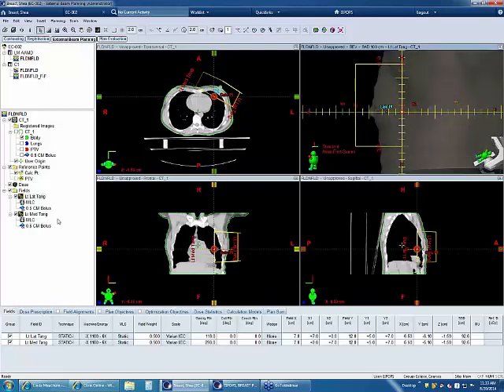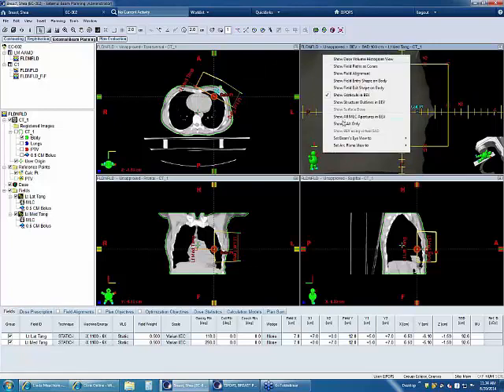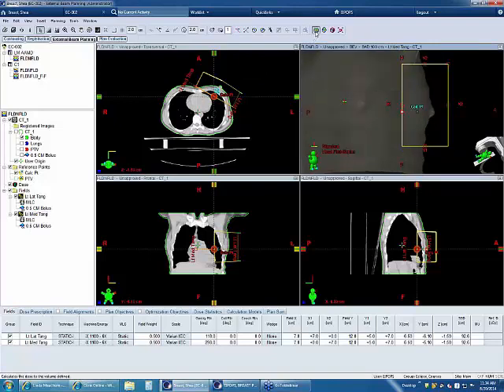And I'll click on the other field, and right in line from there as well, a little over 2 cm. I don't have much tissue here. She's only got about 5 cm at the most tissue. So she's pretty good. It's as good as I can get for a chest wall, but the actual procedure will be the same. So I'll go ahead and calculate this. Take that off. Okay.